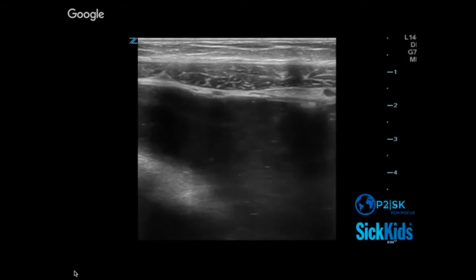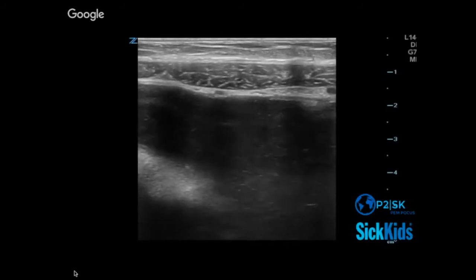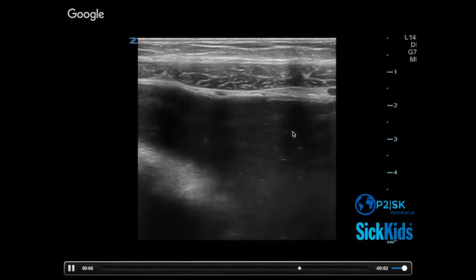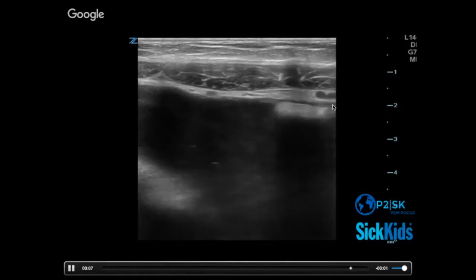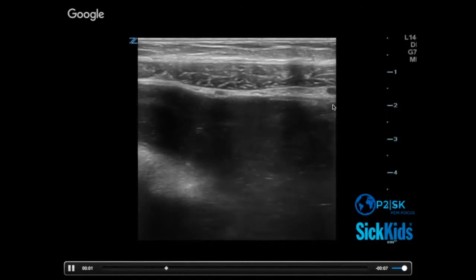She was a missed perforated appendicitis, where probably when she started to complain about pain two weeks ago was when she had perforated. And she had basically ascites from pus, which is what's going on here. I don't believe this fluid is actually contained within bowel walls. I think it's all free. She had a sodium of 115. She was sick. She had a long ICU stay. She developed ARDS, the stuff you don't see much of in the developed world with appendicitis. So just to try to get everything in the continuum on there.